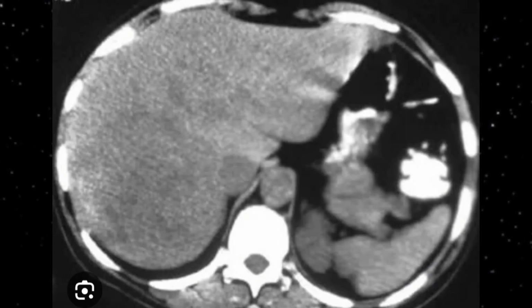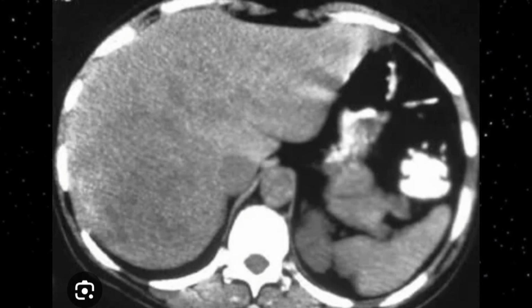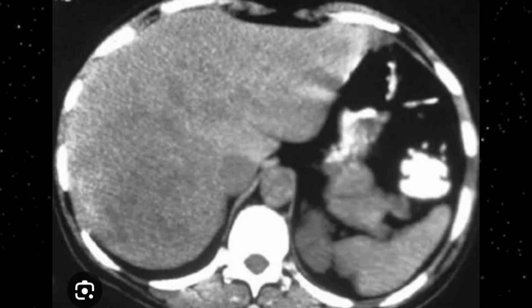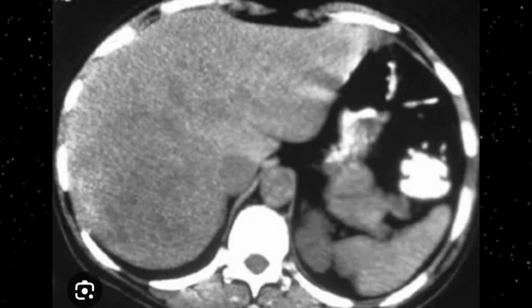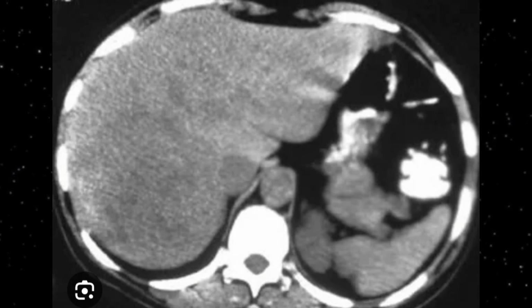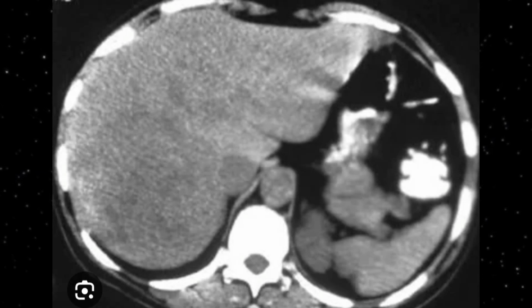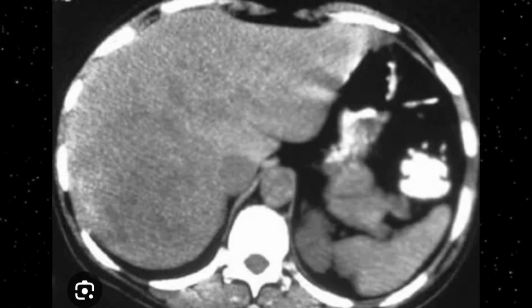This is another CT axial image, and here there is an adenoma as well, but it's a bit tricky. It can be easily missed, so you have to pay attention and look for it, because this is a non-contrast enhanced CT, so there is no contrast given and no uptake there. So this is a simple plain CT.